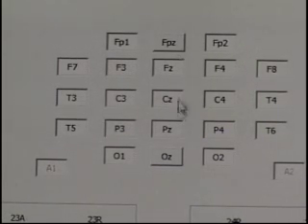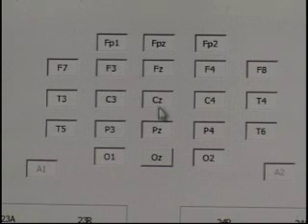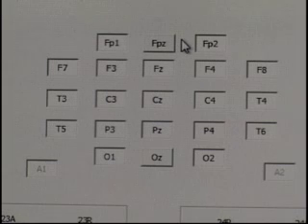You notice that because the Discovery 24E has additional channels, 24 versus the typical brain map being 19, we've added some extra sites that oftentimes people like to add, but we don't automatically select them. If you have a custom cap that has FPZ and OZ listed in that cap, you can go ahead and depress those and make those active channels. If not, if you're using standard electro caps, for instance, you want to make sure those are not depressed so they're not going to be acquired.